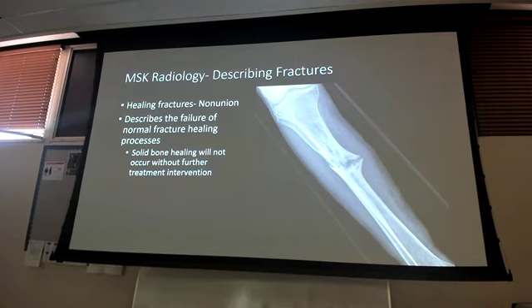Good grief, it's terrible. I think they would probably put a rod in here, to be honest with you, to help stabilize it. If I had to make an educated guess, they're less concerned about the shave off than they are about the instability of the bone. So they would probably go in and put a rod in the tibia to put those two pieces back together and stabilize it, so that we don't have any issues. This, not really a big deal, unless it's causing them some kind of pain or discomfort. But the biggest thing is going to be that 6 to 9 months post-fracture, the bone hasn't healed together, we can call it a non-union.